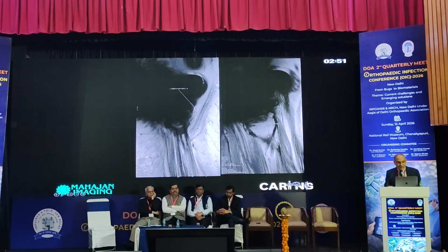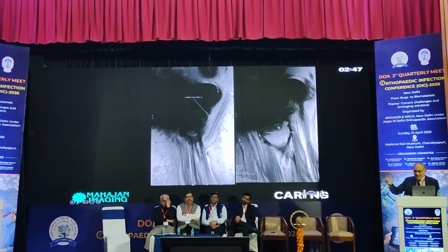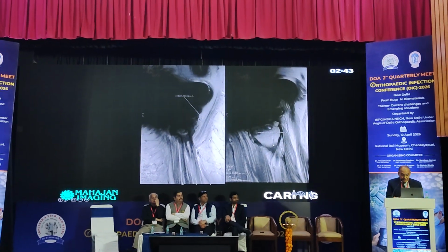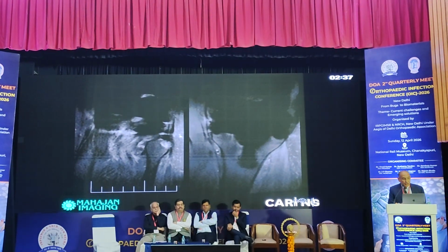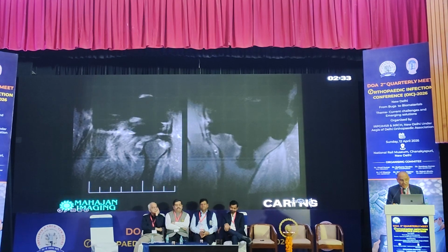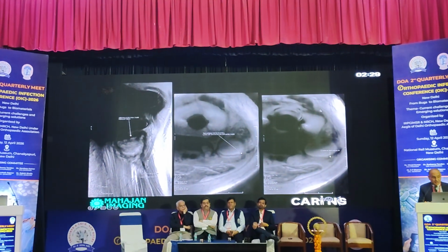around the joint. And this was a case where there was a fracture of the fibular head and a trauma to the adjacent common peroneal nerve, which actually caused the problem. Here you can see again better the edema around the fracture site, and of course you can see the implant.